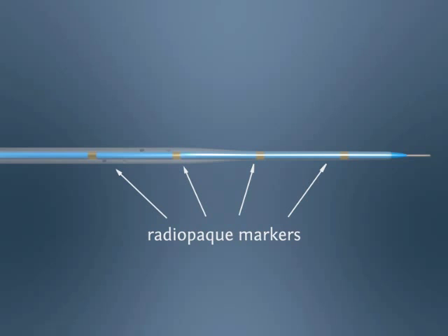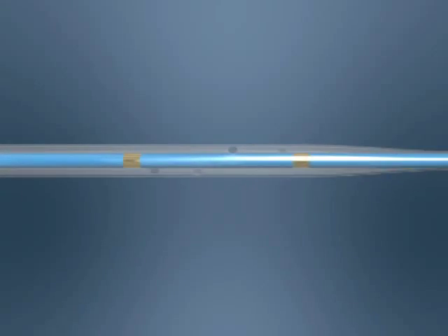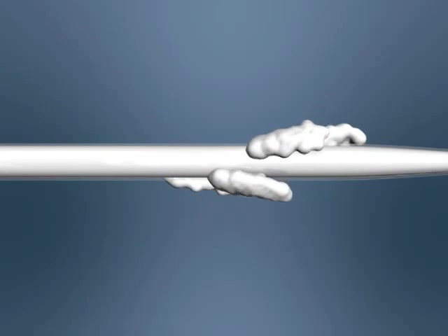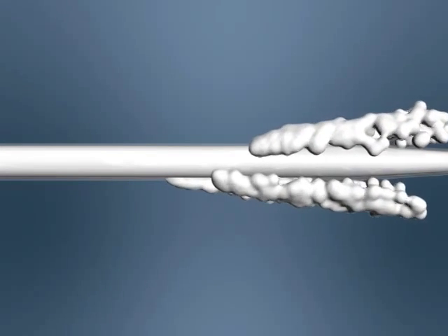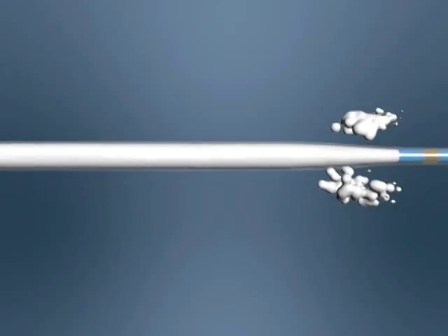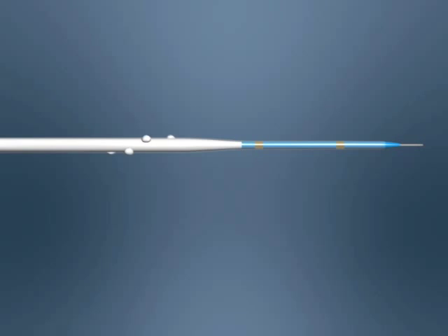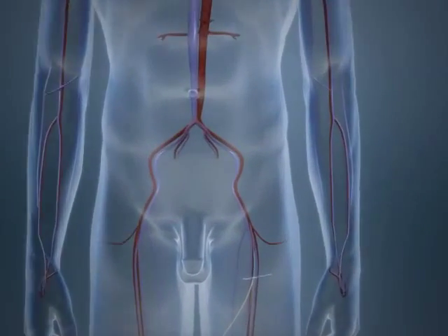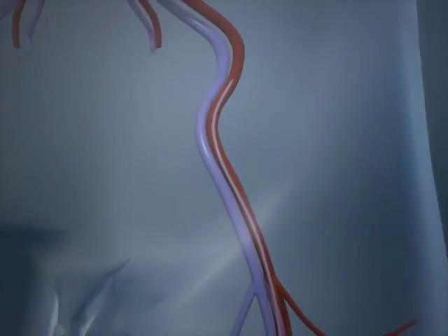There are high flow holes between the 3rd and 4th radiopaque markers, enabling local injection of drugs or iodinated contrast in order to observe the condition of the distal vessel. Proximal contrast media can also be injected simultaneously by means of a guiding catheter, distally to the lesion, enabling the lesion's characteristics to be observed. Thanks to the quick exchange design, the catheter can be moved simply and quickly.